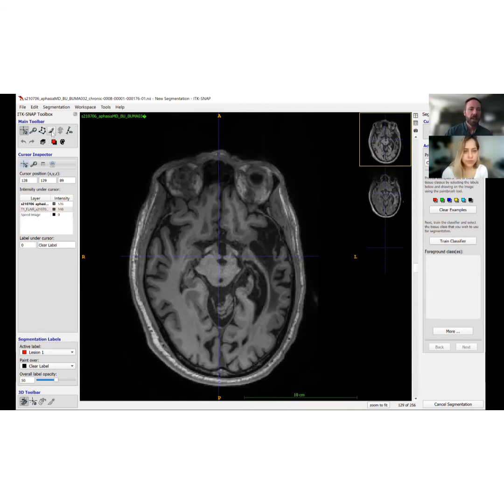I typically use the brush in 3D to mark the examples. And 3D means interpolation, to make it clear, right? As I understand it, 3D means you're painting, for example, if the brush style is a square, you're painting a cube rather than a two-dimensional square, right? Yeah.